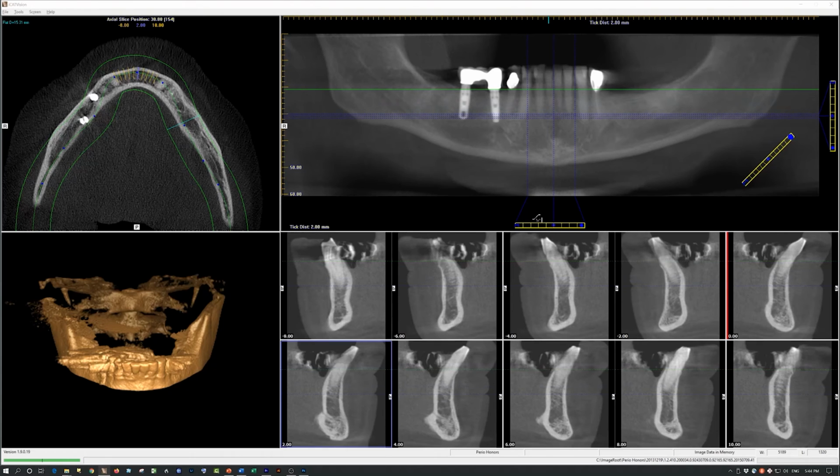Now let's come to the bottom horizontal ladder. Again, it has an M, open blue circle, and a closed blue circle. There are three vertical blue lines. These blue lines represent the images on the bottom screen. This blue line represents the image on this window. The center blue line represents the image in this window surrounded by this blue border. And this blue line represents the image here.